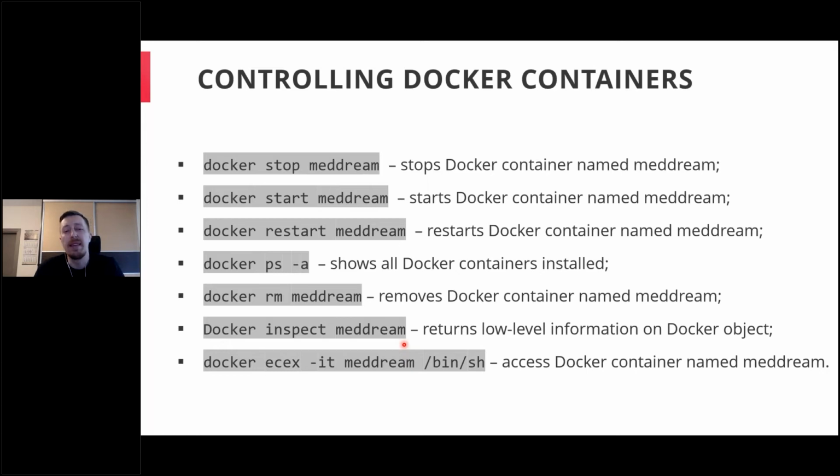And in some cases, you might need to enter the Docker container, MedDream or whichever other container. This is also a quite commonly used command, which will go inside the certain container with sh functionality. So you will be able to browse the files which are inside the container and edit them and do some other manipulations.